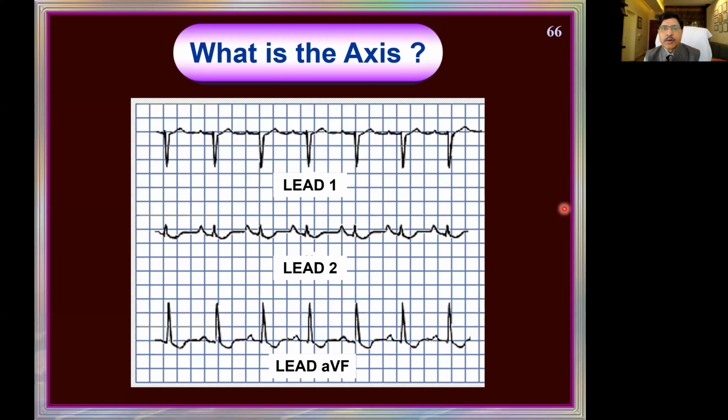We have to look only at L1 and AVF for the right and left axis. If L3 is given, it's okay. L3 also you can look at, or AVF you can look at. Both of them are the same.